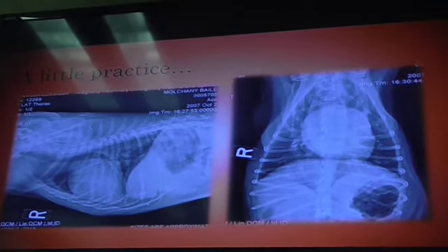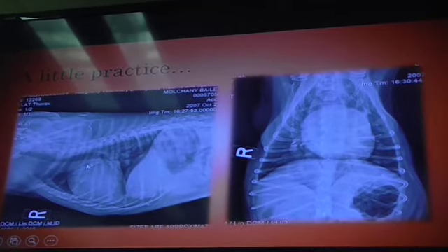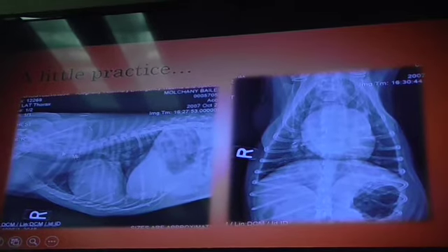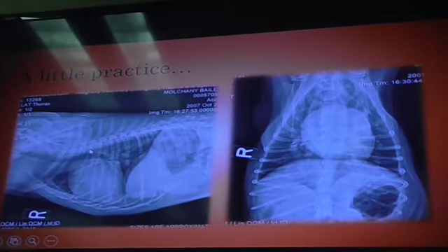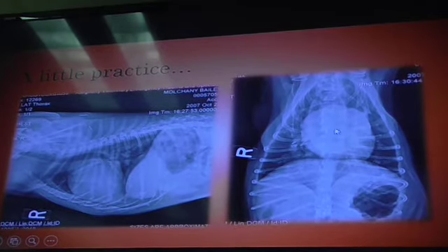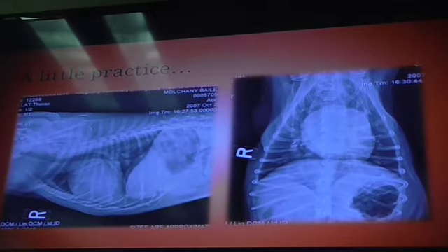Okay? Now, we raised a good question. Well, how do we know that that's artery based off of this image alone? Well, we don't. We just know that it's subjectively large. If you look at the width of that and look at his proximal first, second, third, fourth rib, it's just a tad larger. Okay? I can confirm this finding by looking at the orthogonal view, which is why we say always take more than one view. You guys remember that?